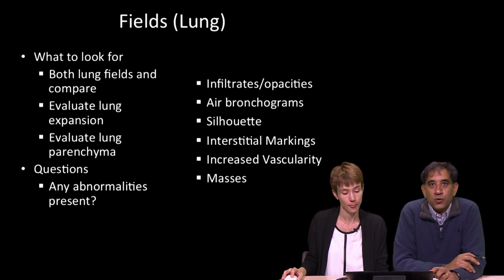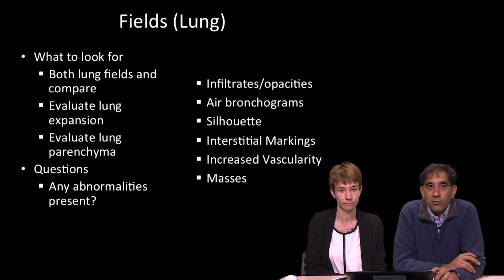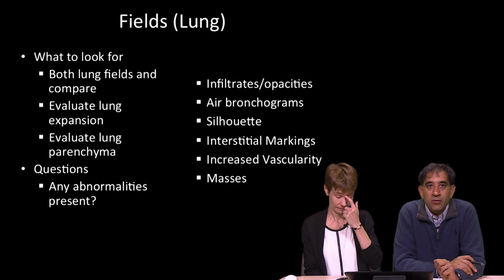Great, and then next we're going to look at the lung fields. And when we're looking at the lung fields, what are we looking for? We want to look at both lung fields, and again, as Dr. Stevens mentioned earlier, compare the two. We want to look at lung expansion and then evaluate the lung parenchyma.